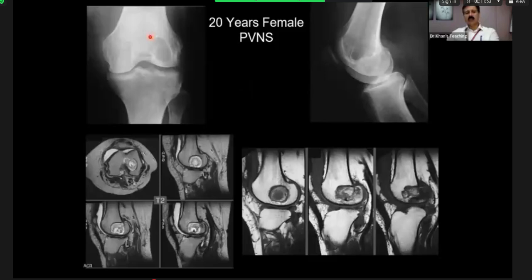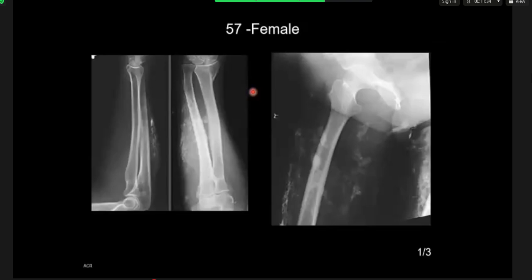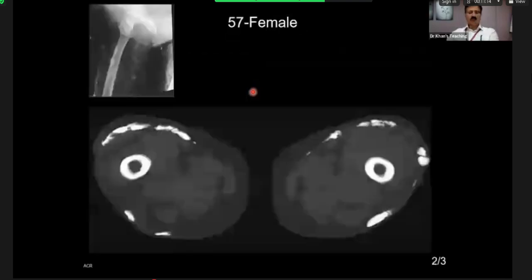Another case where there was an intraosseous component, and on MR you can see that it has gone into the bone. Last few films of the day, and then we are finished. What do you think is this? Visualized limbs, there's extensive soft tissue calcification in the myofascial planes. I think this is likely to be secondary to myositis given the distribution. Right. So this is what we call sheets of calcification.